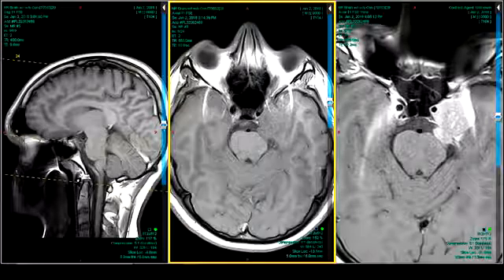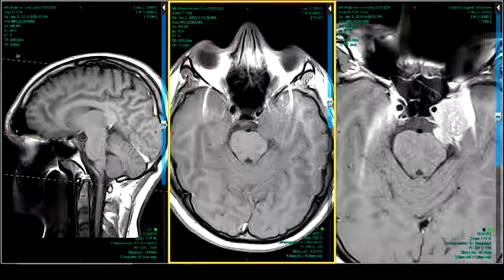Any comments you have on this one? Yeah, one thing is, Dr. Palmer was just talking about a meningioma, but you know, crossing compartments like this, posterior to middle fossa, not too many things do that.